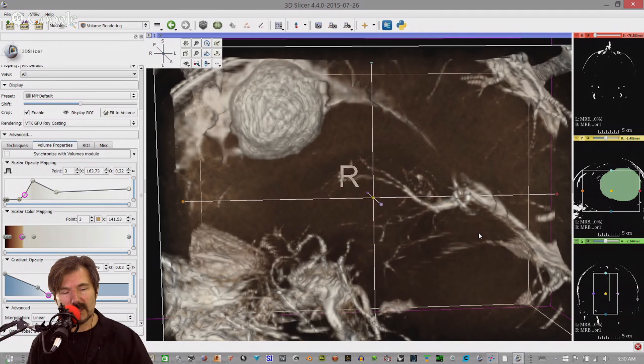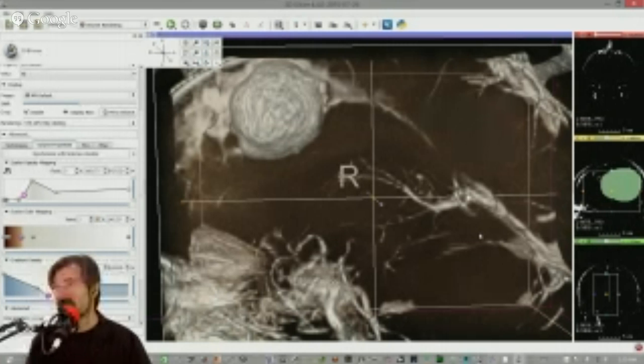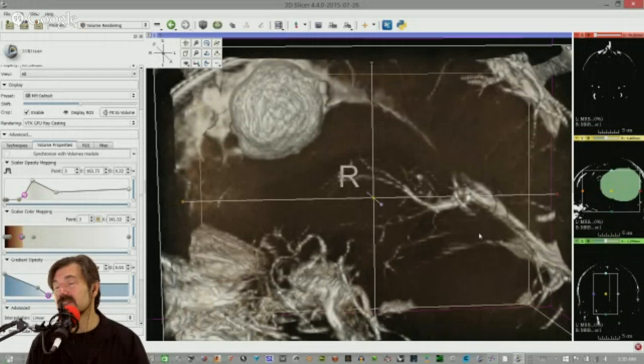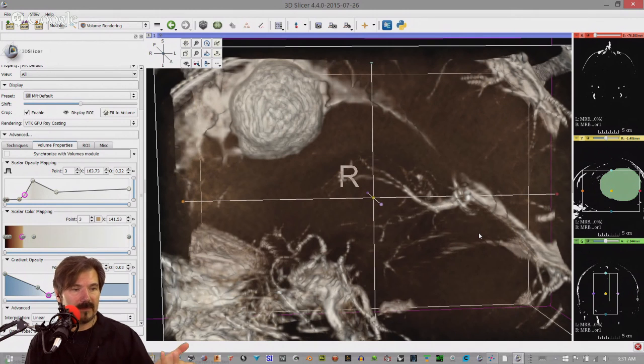In this case, this is more tissue-based versus calcified or calcium-based, which doesn't show up as well. But out of my own curiosity, in modifying this, I'm able to cause the brain tissue to disappear because I'm modifying the thresholds, since it's at a different grayscale level or color level, and then all that's showing up now is the vascular. I'm actually kind of answering this question myself. Yes, it is kind of obvious that you probably have more water molecules, not necessarily a liquid, in the vessels and so forth, so it might be more pronounced.